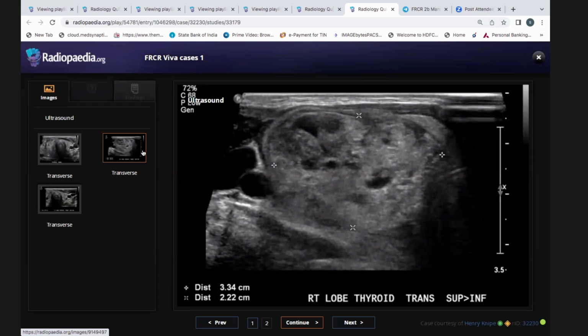Can you tell me what are the findings for the benign and the malignant lesion in the thyroid? Benign lesion can be either a spongiform lesion or a hyperechoic lesion with a peripheral halo, it is usually oval shaped, wider than taller lesion. Whereas a malignant lesion usually will have increased vascularity with punctate foci of calcification within a predominantly hypoechoic lesion. Yes. So with those findings that you enumerated, can you tell me whether this is benign or malignant? This lesion is predominantly hyperechoic without any foci of calcification, and it is wider than taller. So it could be a benign lesion, probably. Okay. Nuclear study was done for this patient.